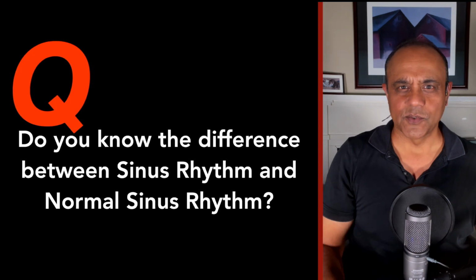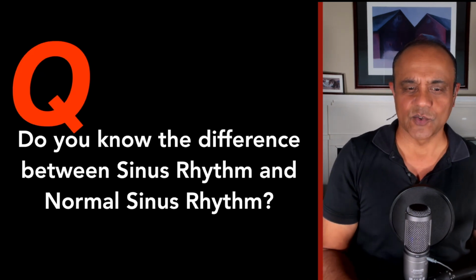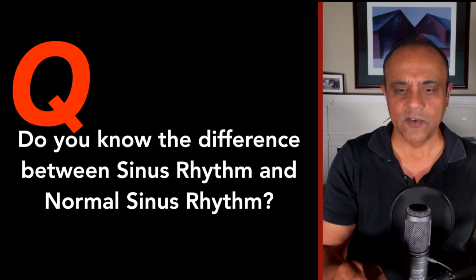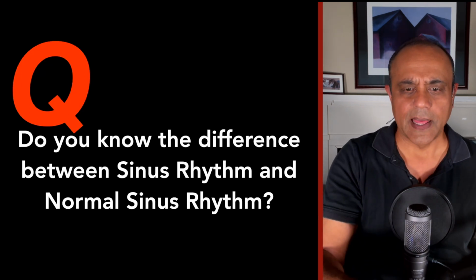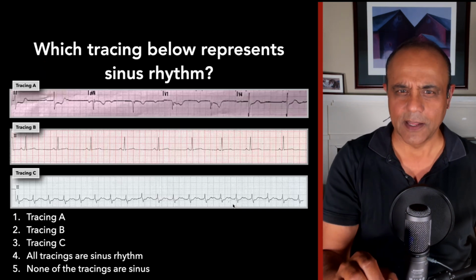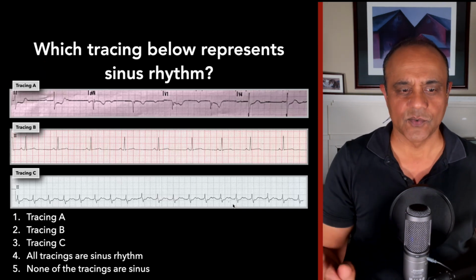Well, welcome to this week's case. Now, do you know the difference between sinus rhythm and normal sinus rhythm? Well, this issue has come up a few times this week, so I thought we'd talk about it and put it to rest. Now, take a look at these three tracings and tell me if you think this is sinus rhythm or normal sinus rhythm.